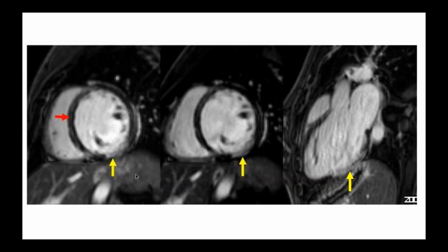And then on delayed gad, she has some mid-myocardial enhancement in keeping with a dilated cardiomyopathy. But she also has evidence of almost transmural enhancement in the inferior wall.